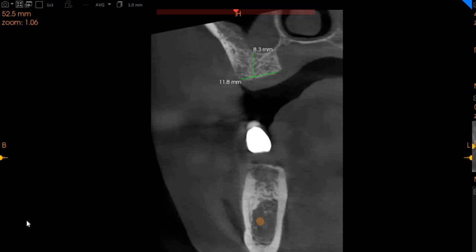So very intense. We've shown you the bone dimensions of each and every tooth in this region. We'll also place implants based on where we believe is the most ideal place. If you have any further questions after that, please feel free to reach out to our team.